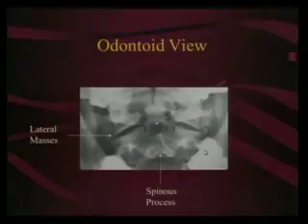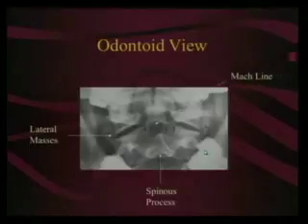Lateral mass, lateral mass, lateral mass, and unfortunately quite frequently we have what's called a Mach line, which is a hard palate, skull base that projects through. That's why we get the different views of the cervical spine that you saw earlier. There's your Mach line.